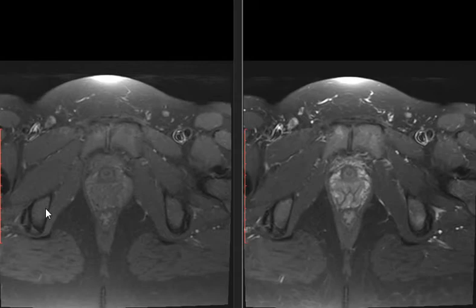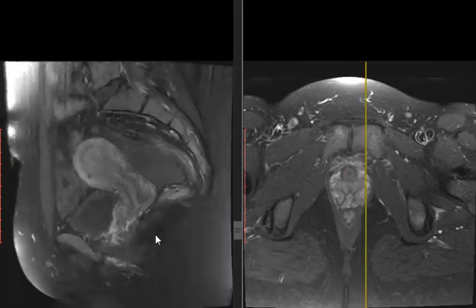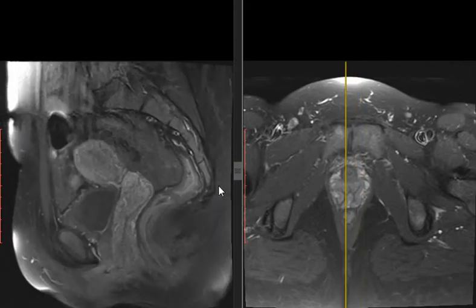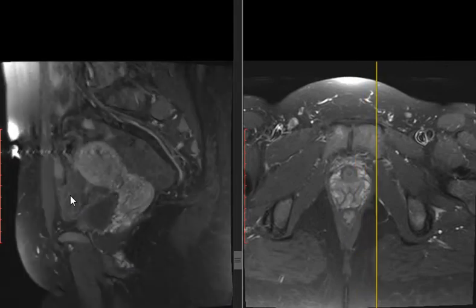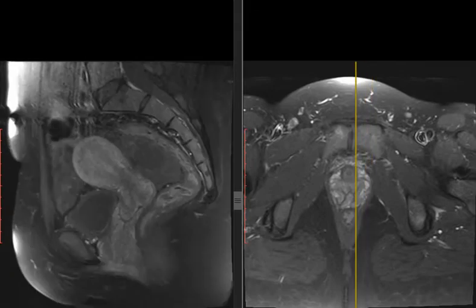Till now, we don't know the origin of the mass. Can we see something surgical? Good note. Very nice. The origin. In fact, the answer is in the origin. Although it's a very rare entity, but try. If there is a small amount of fat, we can put myxoid liposarcoma, if it contains even small amount of fat. Yeah, I agree. But there was not. Take it from me. I don't know why they didn't do T1. I have no idea.